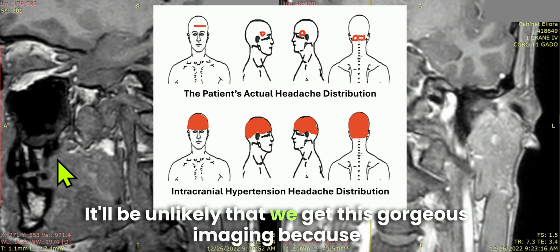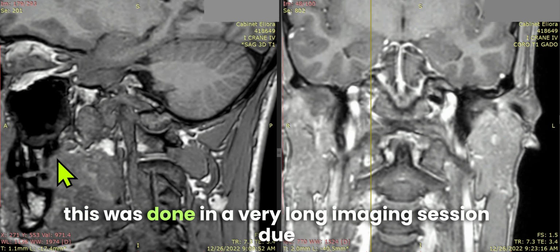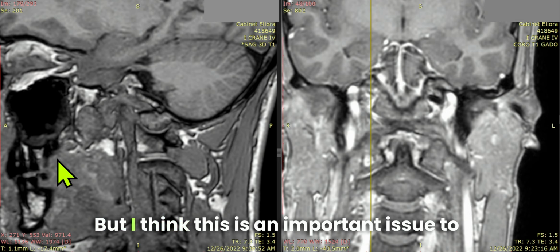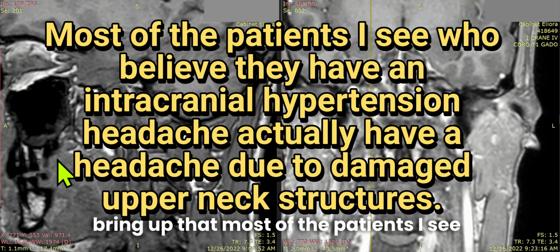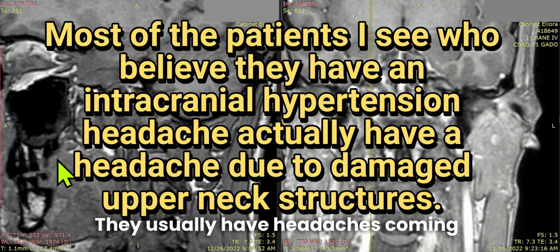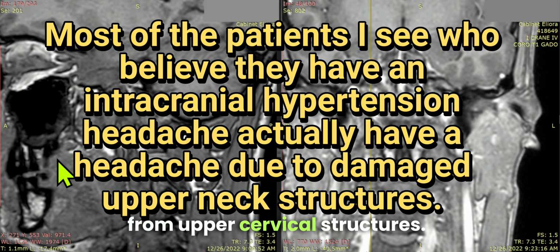It'll be unlikely that we get this gorgeous imaging, because this was done in a very long imaging session due to the number of slices that are here. But I think this is an important issue to bring up, that most of the patients I see who believe they have intracranial hypertension headaches do not. They usually have headaches coming from upper cervical structures.